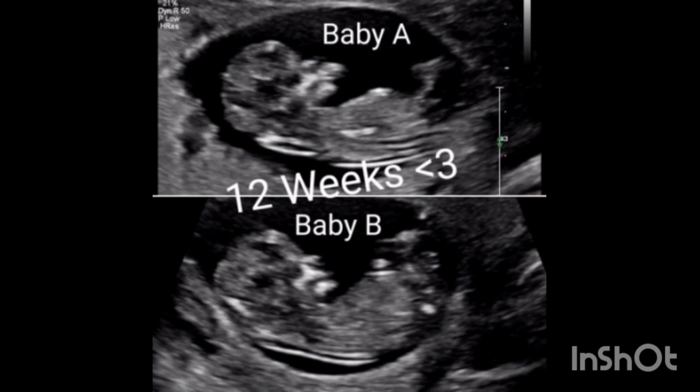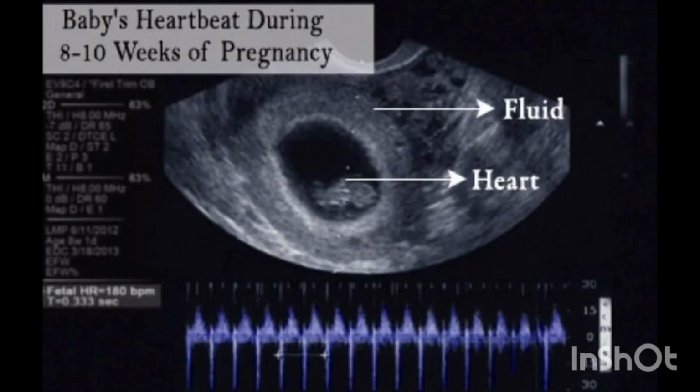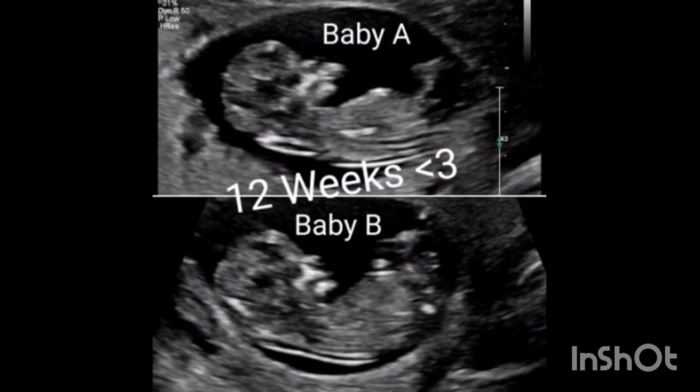Once the fetus's crown rump length surpasses 7 mm, a heartbeat should be detected by ultrasound. If no heartbeat or cardiac activity is detected, then the pregnancy is likely a missed abortion. Normally, the crown rump length correlates between co-twins, although some degree of variability has been observed in multifetal pregnancies.